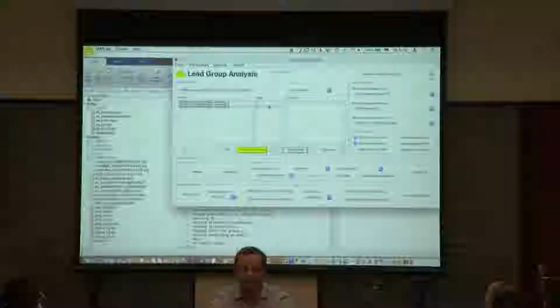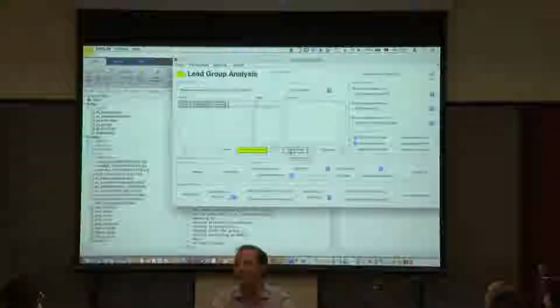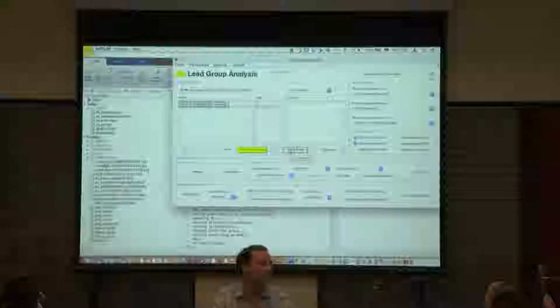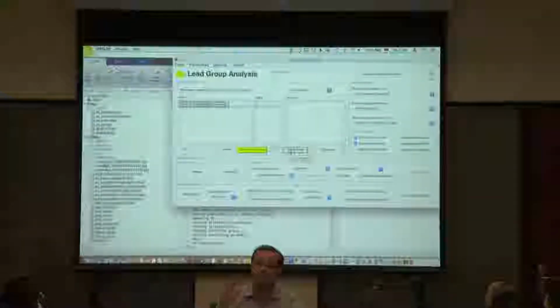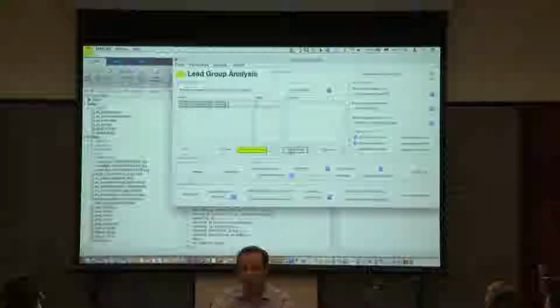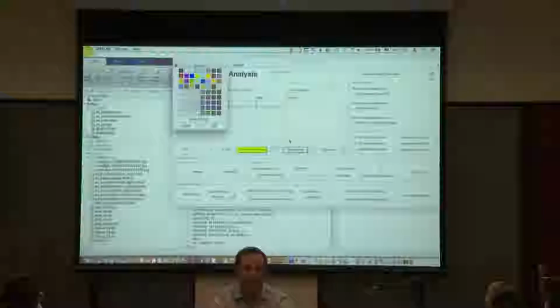Now we have two groups, and we can give these groups colors. A standard example would be to have responders and non-responders, right, or something like that. Or patients with VIM stimulation, patients with GPi stimulation also. So it basically just gives them two groups, and we can now give the groups colors.